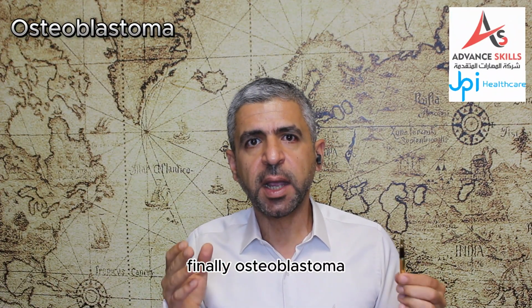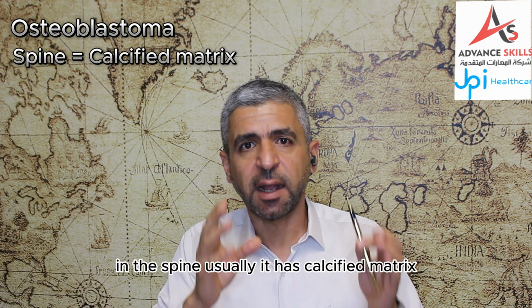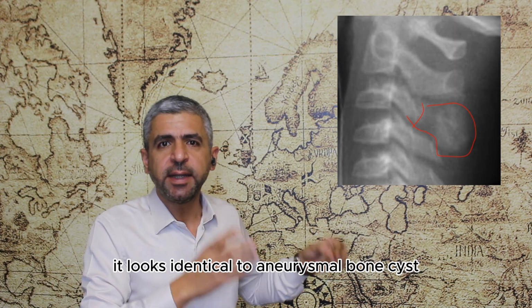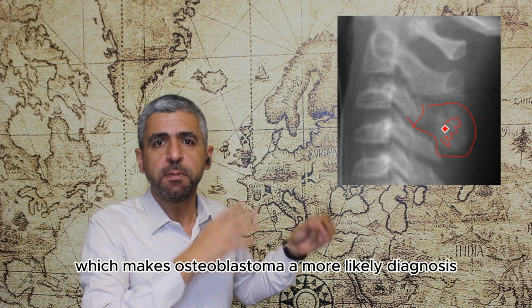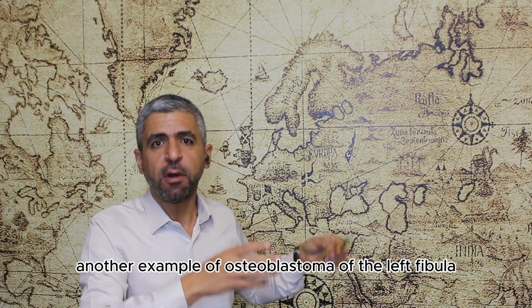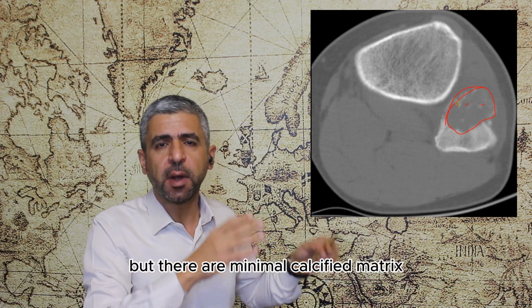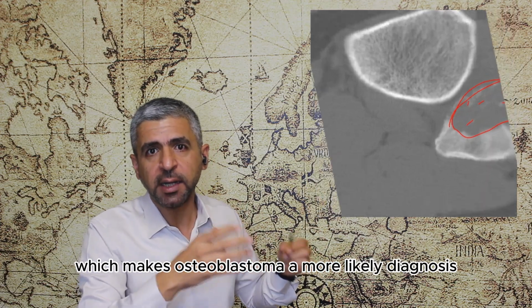Finally, osteoblastoma can look identical to aneurysmal bone cyst. In the spine, usually it has calcified matrix. As in this example of osteoblastoma, the spinous process of C3 vertebra, it looks identical to aneurysmal bone cyst, but there is calcified matrix which makes osteoblastoma a more likely diagnosis. Another example of osteoblastoma of the left fibula, it looks identical to aneurysmal bone cyst, but there is minimal calcified matrix which makes osteoblastoma a more likely diagnosis.